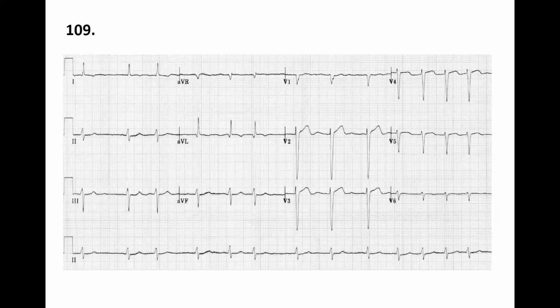Anybody? Very similarly, arrhythmia absoluta, no P wave. Maybe here you can see some teeny tiny noise or something. In V1, that's the best lead to look for the atrial activation. So again, that's an AFib, atrial fibrillation. And if you are looking at the axis, it is positive, negative.